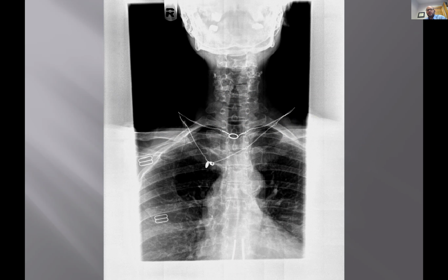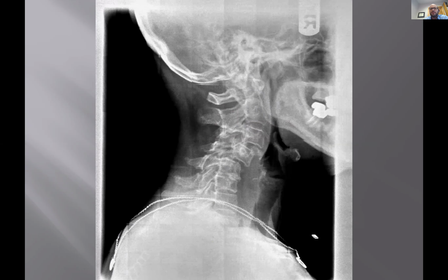All right. The only thing I saw on this case, I felt this was a little bit convex laterally here, and I don't really like that. There's a little prominence of the aortic arch, but whenever I have convexity on this side in the region of the hilum, I would follow up with a PA chest radiograph just to make sure it's okay. That's not the main reason I kept it. Here's the main reason I kept it.